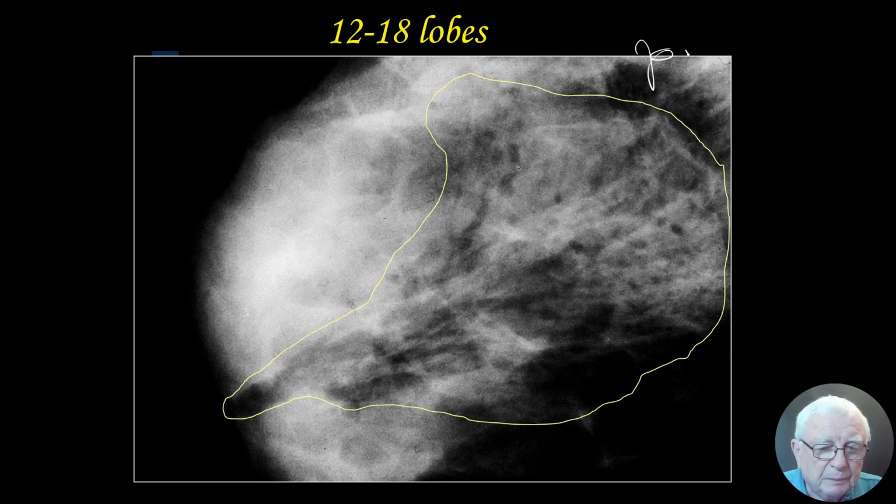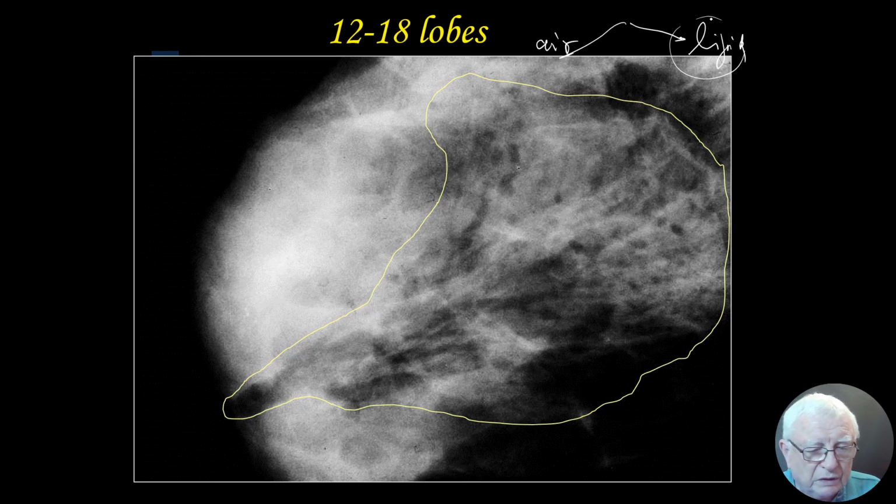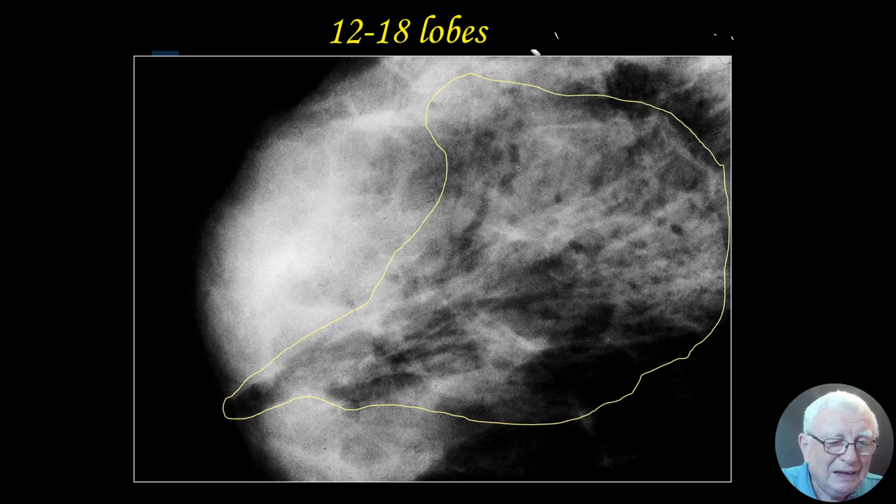Why does she have pain? She didn't have it a week ago. And it bothered her so much that she asked for an emergency mammography. What is this? Which one of the 2 options? Lipid or air? Now, unfortunately, doctors always think about diseases. There were colleagues who said, oh, this is a gas-producing bacteria. No. Don't do that. Don't. But it's air.